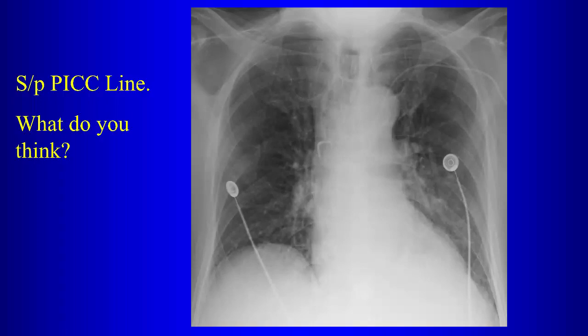No, I think I said it. Does this bother you at all? Now you're bothered. I see lung fields that have like... All right, but it's a portable chest radiograph, right? Questionable. Well, no, the scapula's out here. I want to zoom in. This is not the scapular border.